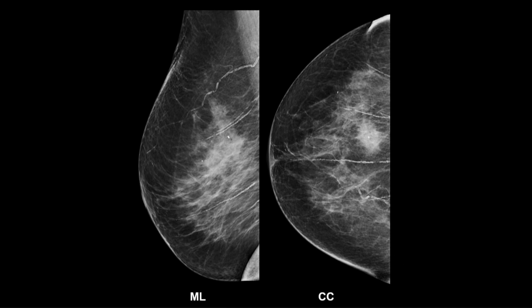Okay. We did a sonographically guided core biopsy, and this image simply shows you that we biopsied from the correct location and the area where we thought the finding was on both images. You always want to get a picture like this to validate that you biopsied in the right place. And if for some reason your clip is not where it should be, then you have to make a decision of whether this is the accordion effect and you really did biopsy in the right place, but when the breast expanded out of compression that the clip moved a little.